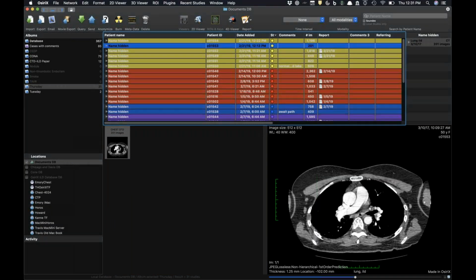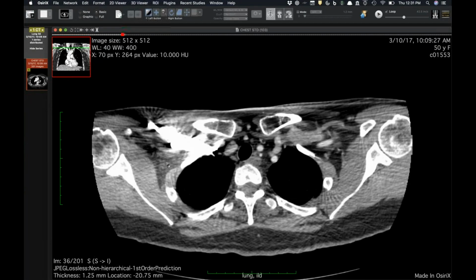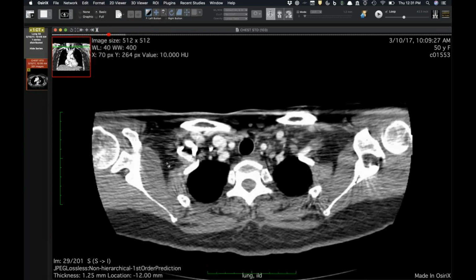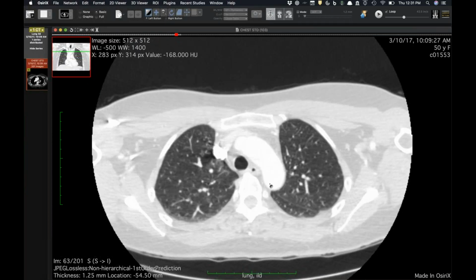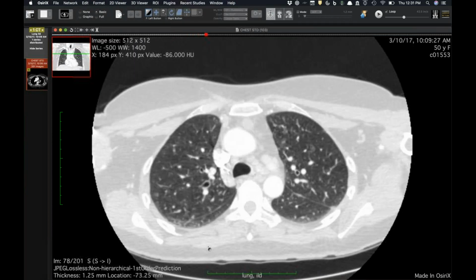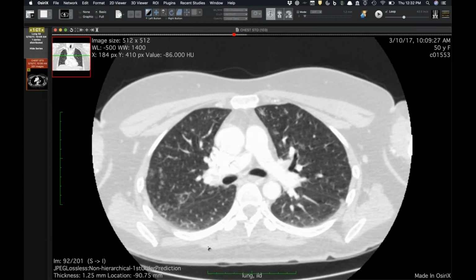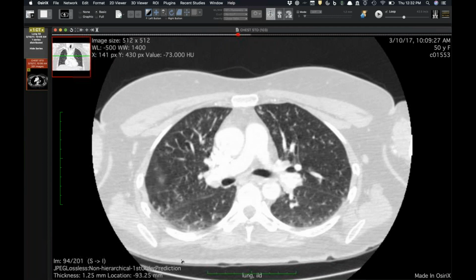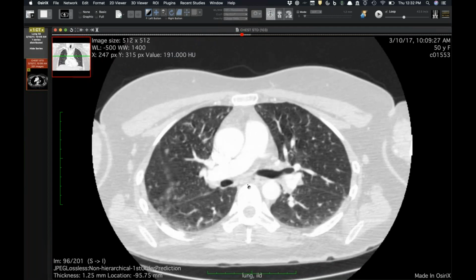This one, let's see, which one is this one? Oh, this is another interesting one. This came into our ILD clinic a while ago, and this is a 50-year-old woman. And Howard, I think it was you or Jeff a couple weeks ago, or within the last month, that showed a case of idiopathic follicular bronchiolitis? It was Howard. Yes. I did. Well, I've been reviewing a lot of our cases, and this is another case.